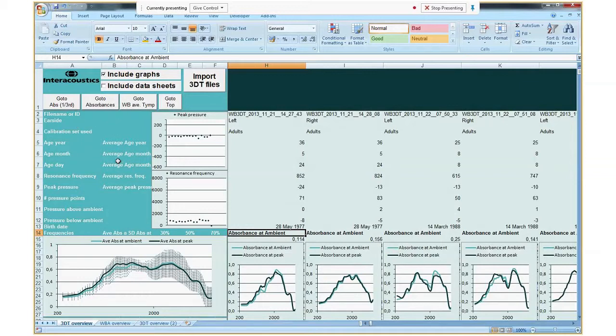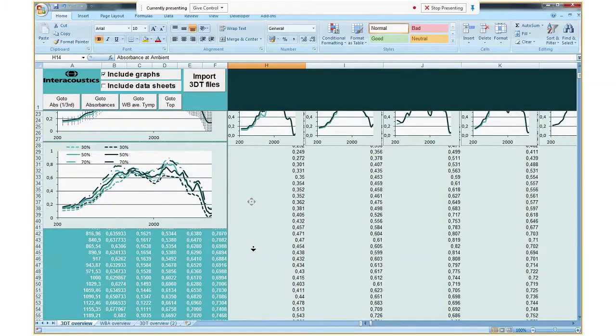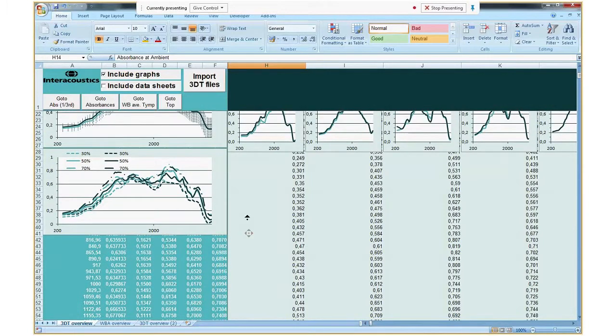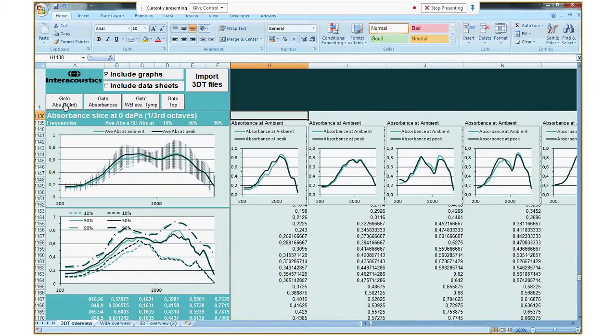One person already asked me for something special. They wanted specifically the absorbance, not as it is measured in all detail. They wanted the absorbance with a moving average of 1/3 of an octave, and that is why at the bottom, and I can jump there by clicking the button there, there is also data where the moving average is already calculated. Now, if this 1/3 octave moving average data is interesting to you, then please contact me and I will explain how this data handling is done.